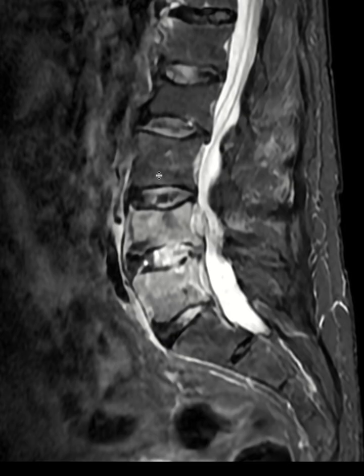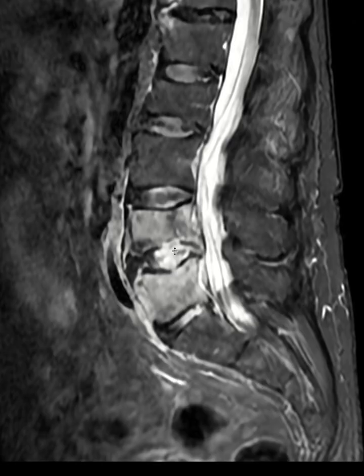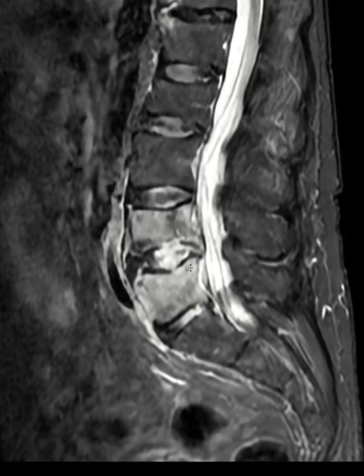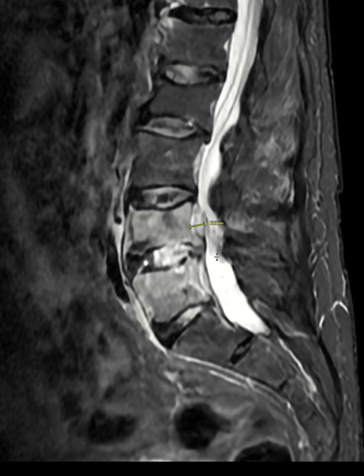If I look closely, the findings I showed you on T1 are again showing up on this third sequence: we have some epidural involvement as well. So this is epidural phlegmon or epidural abscess formation in the setting of Discitis Osteomyelitis, when it is getting chronic and untreated.